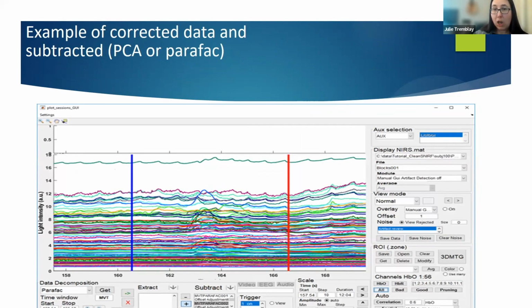As both methods are sensitive to outliers, it could be good to remove channels that need to be rejected because of the acquisition. The way you select the time and interval will influence the decomposition. So it's usually helpful to target the decomposition for distinct events.